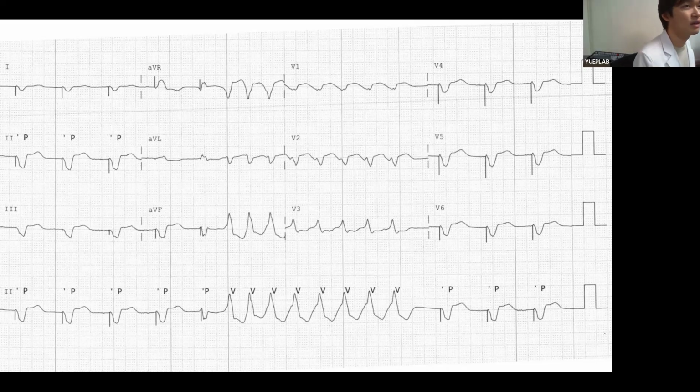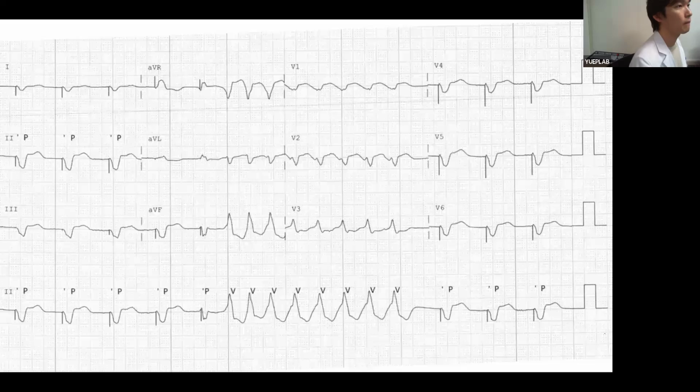심전도 실장님. 여기서 심전도 실장. 이게 스탠다드 EKG였잖아요. 외부에서 본 거. 이게 뭐 스캔된 거를 가져온 거예요? 아니면 뭐? EMR에 EKG라고 해서 스캔이 올라와 있긴 했었거든요. 저희 쪽에서는 그런 건 아니야. Outside hospital EKG? 근데 그건 저도 사실 확실하지 않은데 의무기록사본 이런 데서 가져온 거. CCU? 네, CCU입니다. CCU는 가능하지. Philips telemetry displays all precordial leads.